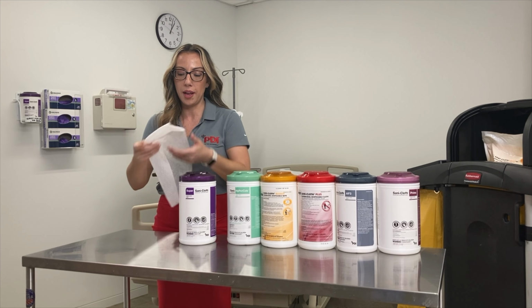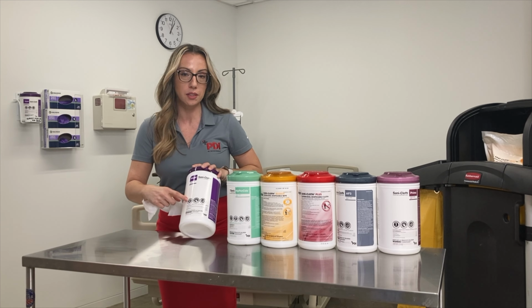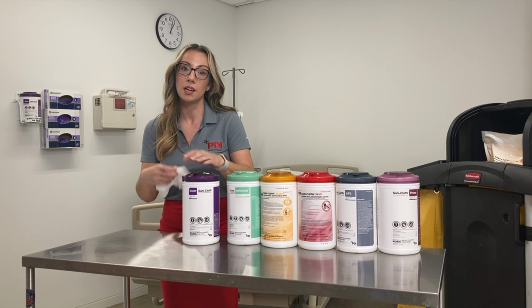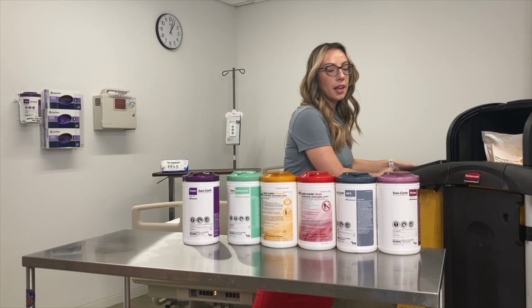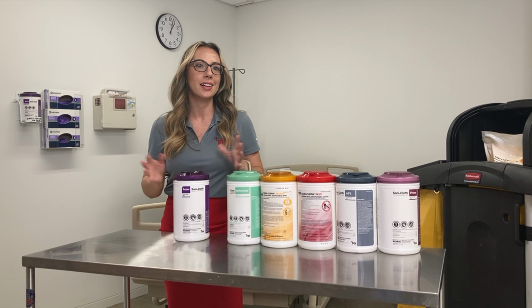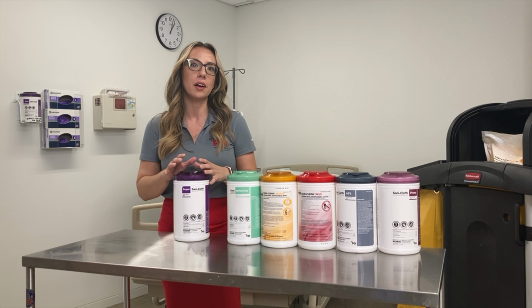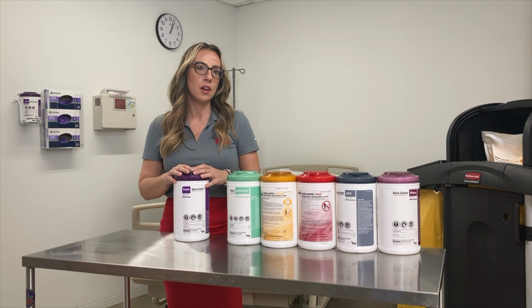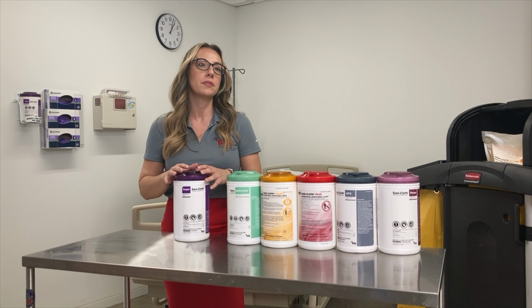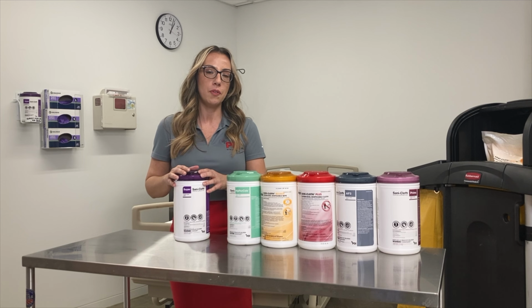You simply pull your wipe, you wipe your surface for the designated contact time, which we clearly have labeled on all of our canisters, and then you just throw your wipe away and let our products do the work for you. And although you may think, hey, it's just a wipe, PDI differentiates ourselves in the market by our commitment to infection prevention. We have a robust support system, a dedicated sales team, expert clinical science liaisons, and compliance and accessory tools. These all help our customers meet their infection prevention goals.